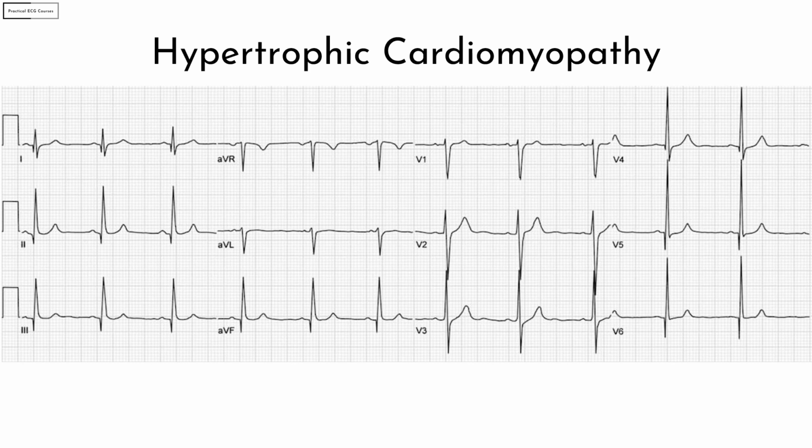So, whenever you see a patient with syncope, especially a young patient with syncope in the ED, always look for HCM. This ECG is quite good because it has the signs of both LVH as well as deep, narrow, dagger-like Q waves of HCM.